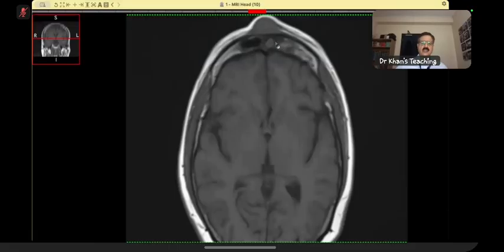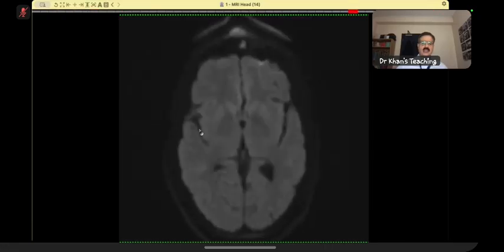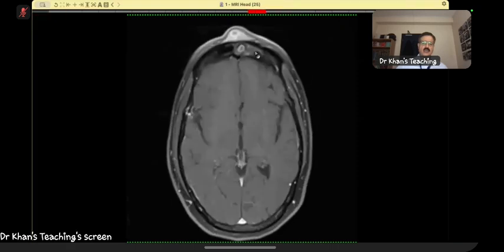Within the left frontal sinus, there is a localized collection, and then there is soft tissue. So the candidate did well, did not ask for T1, which should have been asked, and then asked for diffusion, which was fine. On this diffusion, we can see that there is a bit of restriction here, and there is that frontal collection, localized, and this is the soft tissue. And on post contrast, we can see that everything is enhancing, and then this thing also shows enhancement.